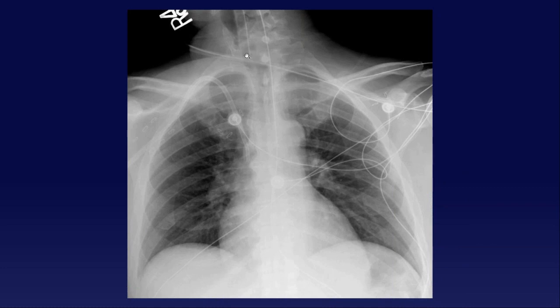Look at that. There's the ET tube. What's wrong with it? Any ideas? Way too high, above the thoracic inlet, right? You could be ventilating this person's stomach with how high this is. And that's the balloon up there, so it's actually inflated in the larynx. This is really bad, okay? So you definitely want to reposition this one.